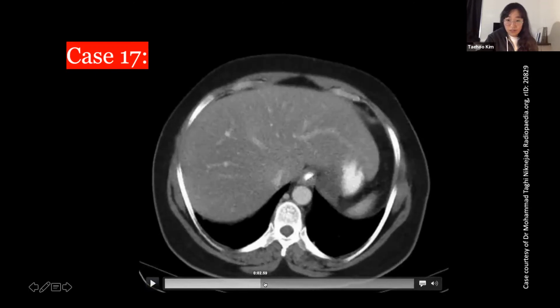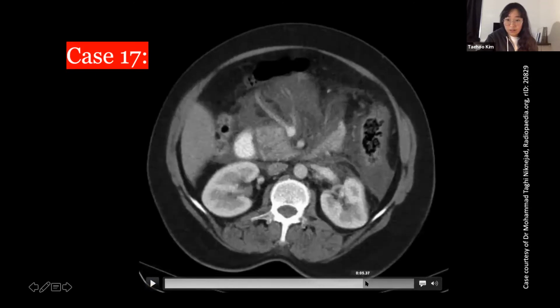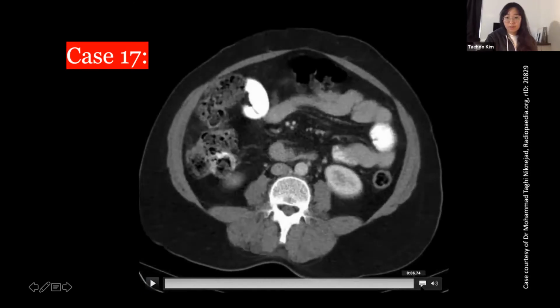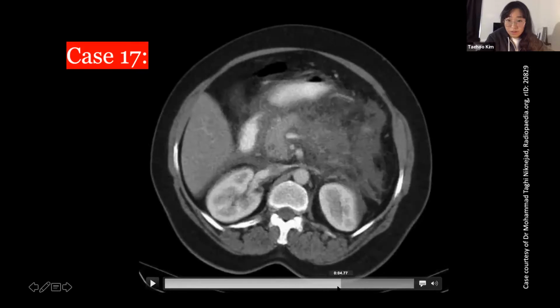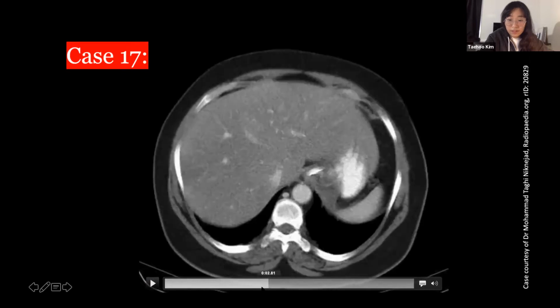Okay, 17. Again, I'm scrolling down. There's an NG. Okay, I'm going to go back up. Oh yeah, it's a revision case.